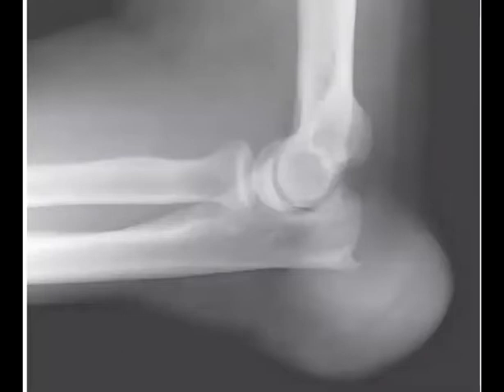Yeah, tophaceous gout, one of the good differential. So soft tissue swelling and tumefaction. So you will describe it as radiodense mineralized soft tissue lesion. So doc, in the olecranon bursa, perfect, and it's good to mention that there is maybe some bony fragmentation here.